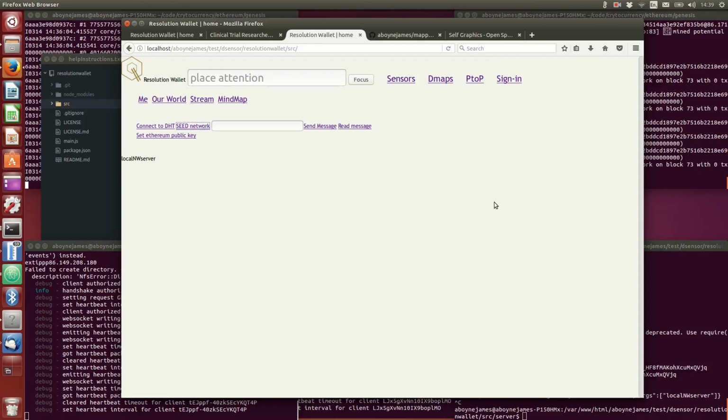Welcome to this DSensor peer-to-peer living cohort clinical trial demo using wearable data. The use case we're going to show in this demonstration starts with the individual here in white, and there'll be a trial manager or clinician running the trial in this sort of blue background.